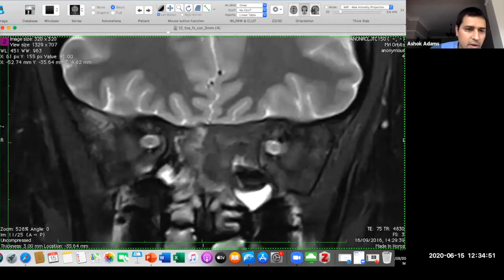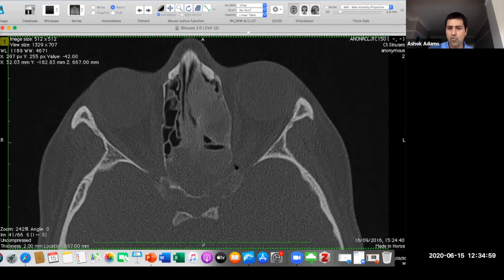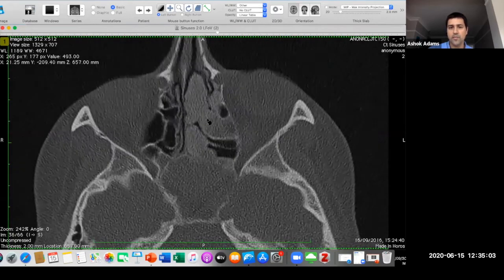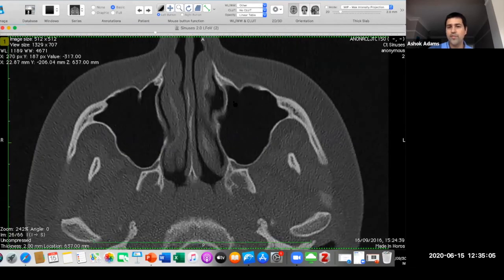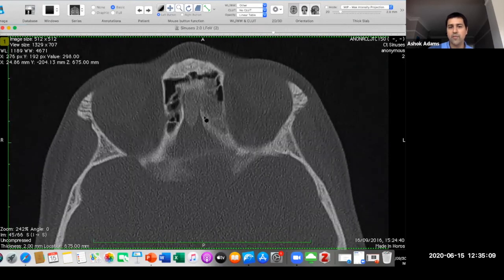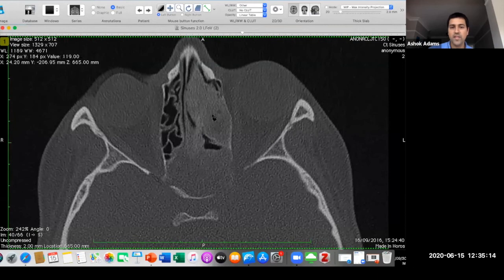So if we go back, this patient was quite young. She's a young female patient. The optic nerve involvement was because you've got this abnormal intrinsic skull base process, and this has a slightly ground glass appearance. So this was not a problem with the sinuses per se, but actually a problem with the bones. And this was a young patient with fibrous dysplasia. So this is the typical pattern that we see on a CT, this kind of ground glass opacification.